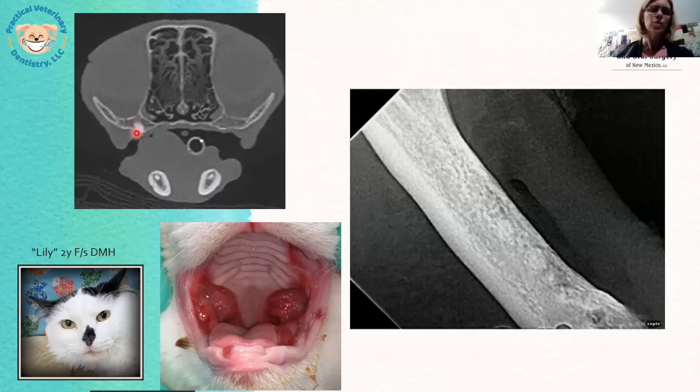there is actually a maxillary tooth, and I could see that one on the dental radiographs. But looking at the dental structure here and the way that it appears in the maxilla, now you can see that there's dental structure in this mandible, and there is dental structure in the other mandible as well.